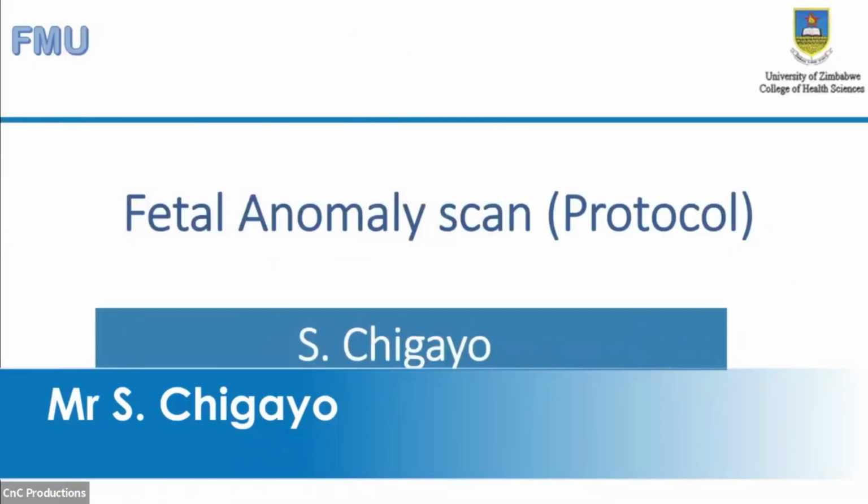Thank you, Mr. Zanga. Okay, so I'll be taking you through the fetal anomaly scan. For the fetal anomaly scan, we are going to look at the images that we expect you to produce when you are carrying out your anomaly scan.